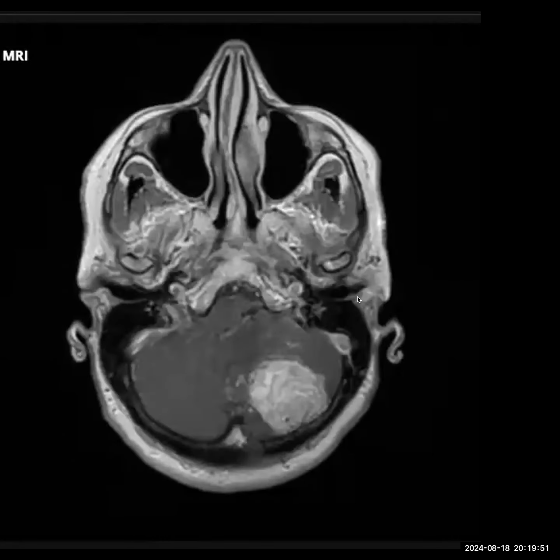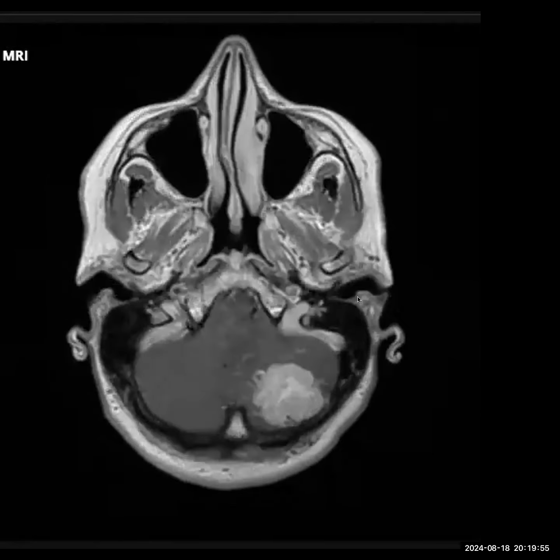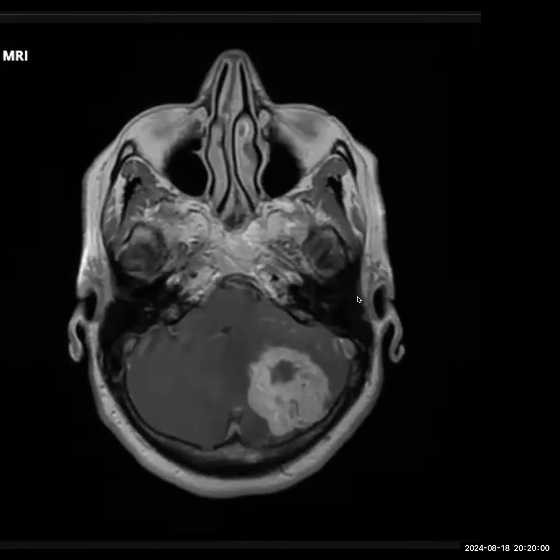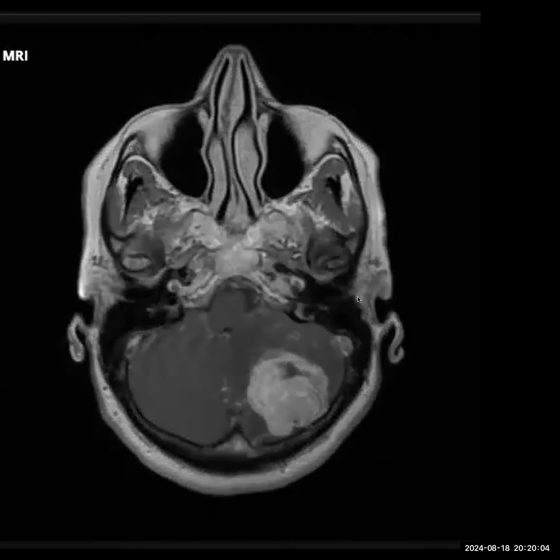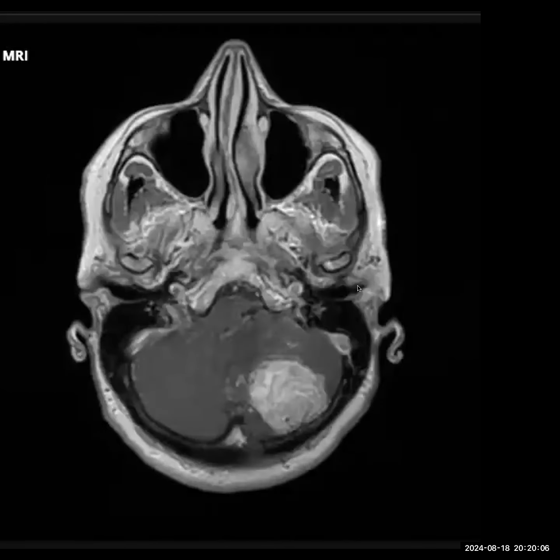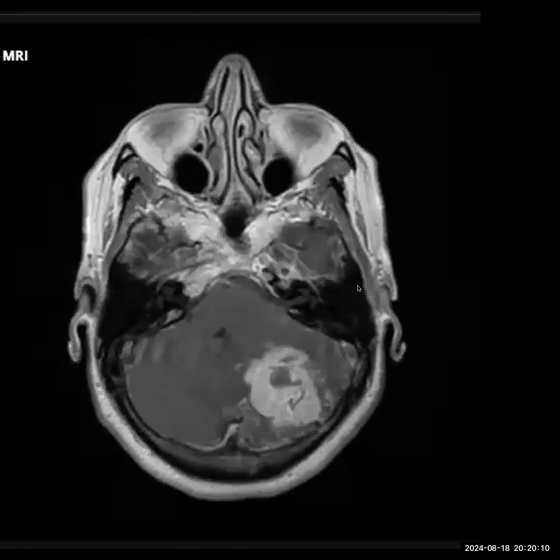But I'm telling you that this is related to the lesion that you're seeing currently in the brain. I'm thinking of syndromic associations. Is there any other sequence you would like to see? Or you would like to just stick with metastasis and go ahead? Please mute everybody else. Yeah, please go ahead.